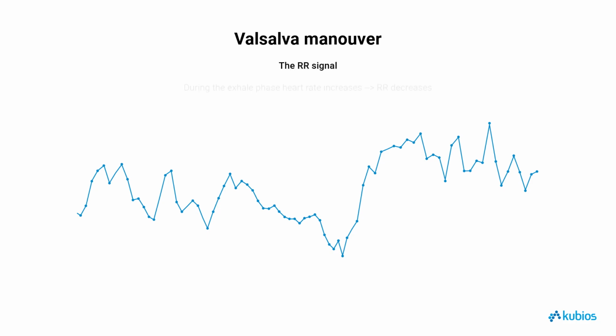During the initial phase of the Valsalva maneuver, heart rate typically increases due to heightened sympathetic nervous system activity. This sympathetic response is initiated by a transient reduction in aortic blood pressure, a consequence of the increased intrathoracic pressure diverting blood away from the heart. Immediately following the forced exhalation, heart rate may continue to rise briefly. This subsequent elevation is influenced by both the natural inspiratory reflex, which induces vagal inhibition, and the somewhat delayed response of the sympathetic nervous system.